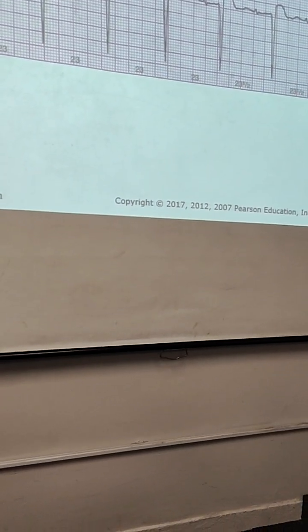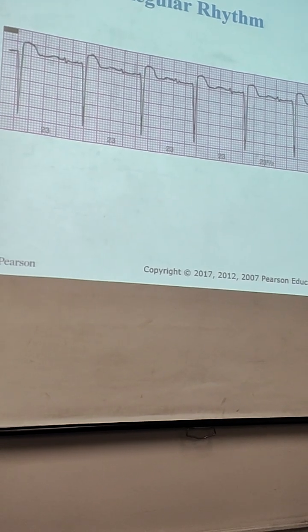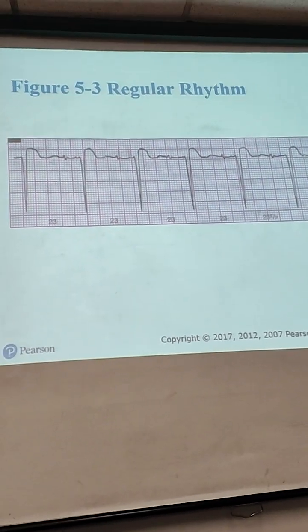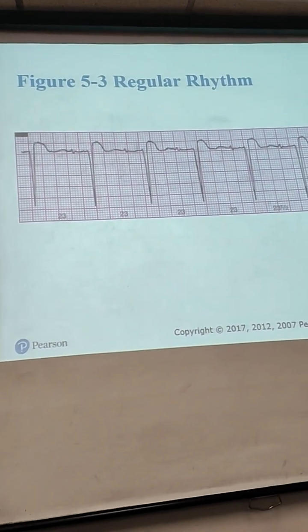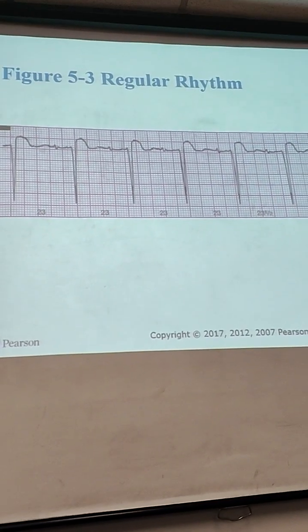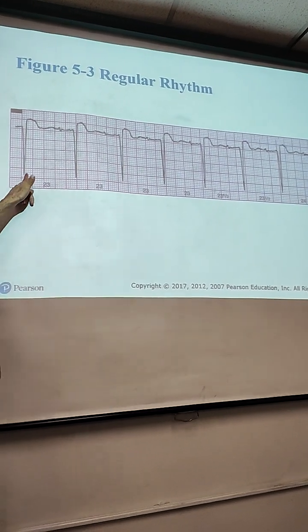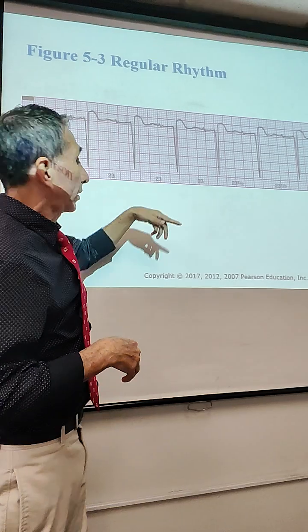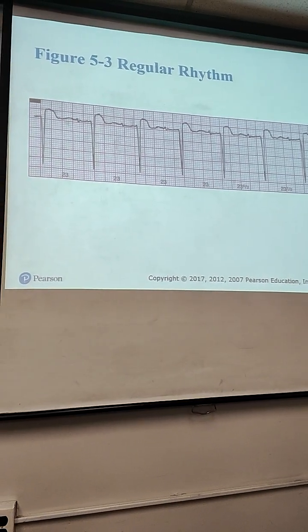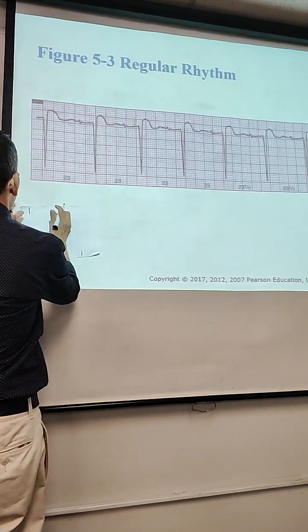Okay, so is this regular or irregular? Hold on. I think it's regular. I think it's irregular. Remember, don't look at it and say it's upside down. We're not saying here whether the patient has a problem or not. Regular means from here to here, and from here to here, is it the same space? So it's regular, because the timing is the same. It just varies a little bit.